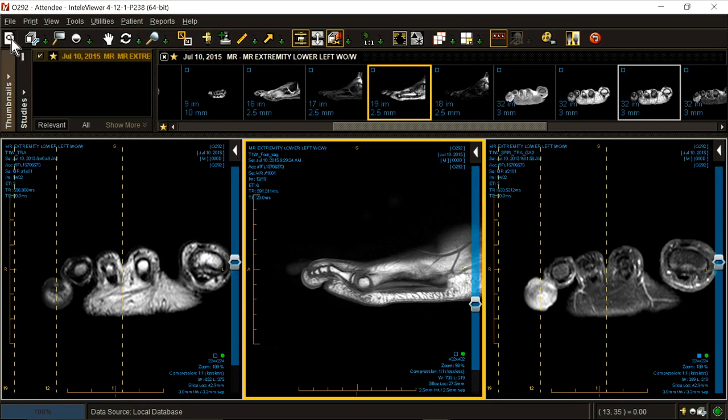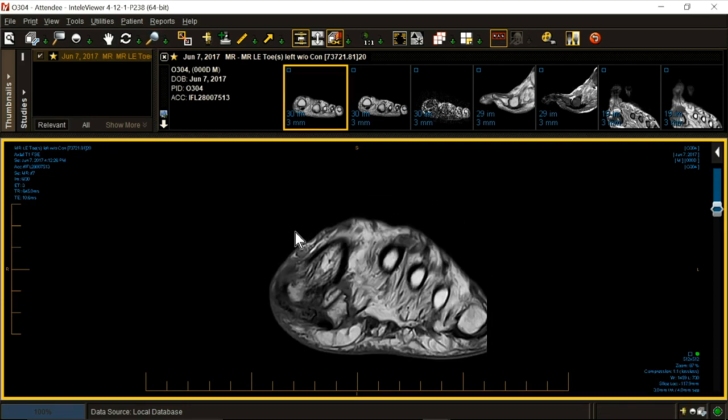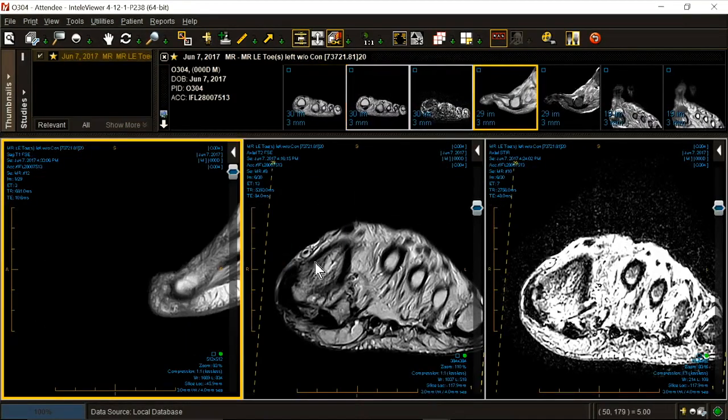You're 1 for 1. Ankle, foot, chronic, neuropathic ulcer in a diabetic with erosions. Evaluate for osteo. Wound is at the great toe. Stay with the sagittal.